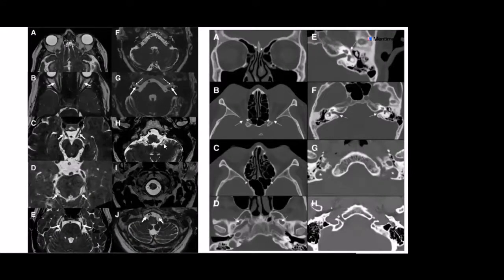It's difficult to call which one is the vagus nerve and which one is the glossopharyngeal nerve on the axial sequences, but for confirmation you can review oblique or sagittal images. And these are the spinal accessory nerves, accessory nerve, and then this is the hypoglossal nerve. For that you have to see the vertebrals and the posterior inferior cerebellar artery and, at the level of the hypoglossal canals.